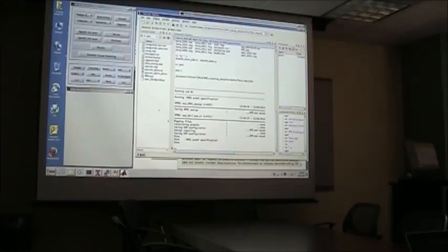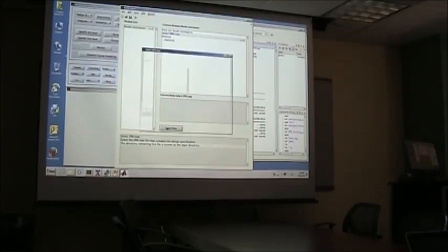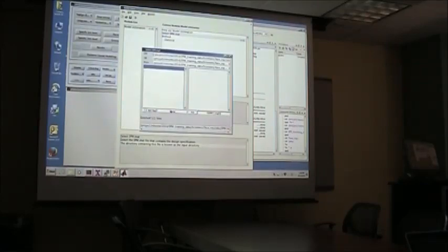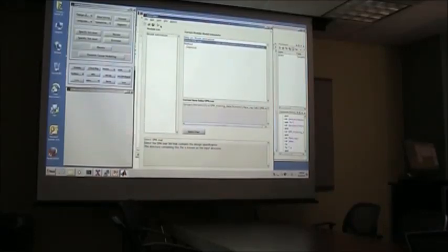Okay. So what we've done now is run the model. This model running goes in a couple of different steps, which you can also add in your batch editor to do at once. Right now I've just done the specification, which means SPM just made the setup, so to say. It hasn't actually estimated any beta values or anything. So we'll do that with this step. In the model that we just set up, I'm going to estimate the fit of the model, and then I'll have a look at it.